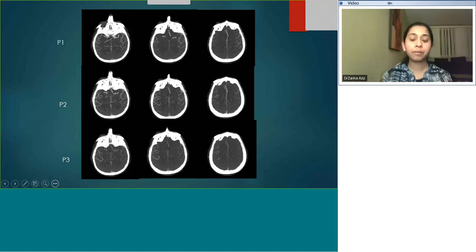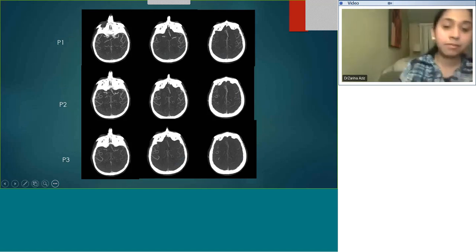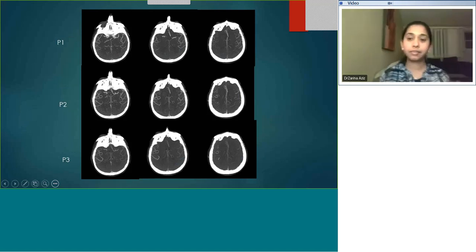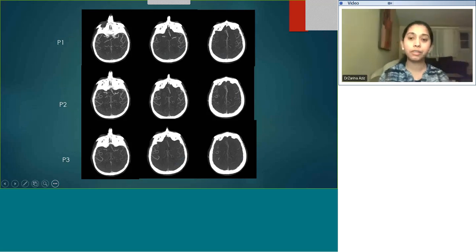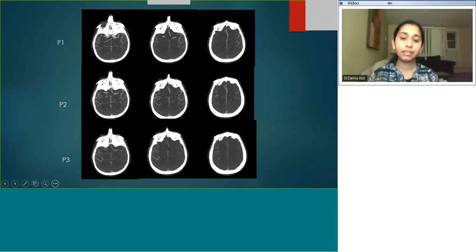So this is about multi-phase CT angiogram for assessment of collaterals, and this is being advocated by many of the clinical stroke teams now. It would be nice if even places in India can start doing this for collateral imaging. And this has almost replaced CT perfusion because it's easy to do the interpretation, because it is more subjective. You can just look at it and interpret whether it is good collaterals or bad collaterals. A lot of scoring systems are coming now, but nothing in clinical use yet.